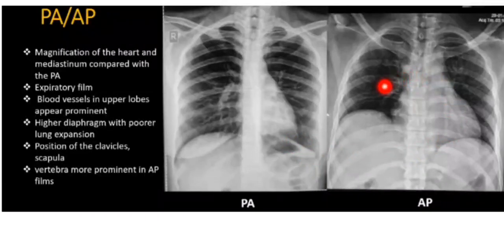But when the patient is sick and lies in a supine position while we take the X-ray, the patient cannot do a good inspiration. So we are expecting less air, or low inspiration, in the AP X-ray since the patient is sick.